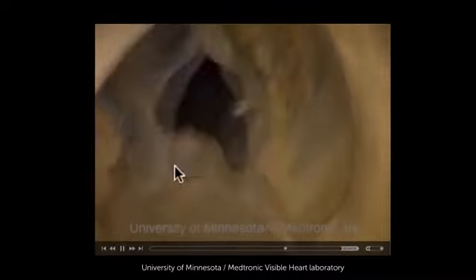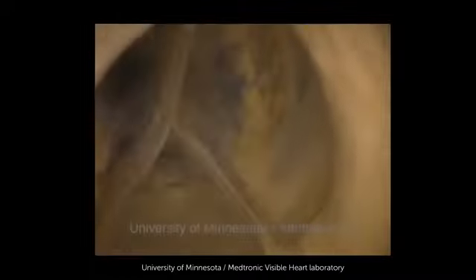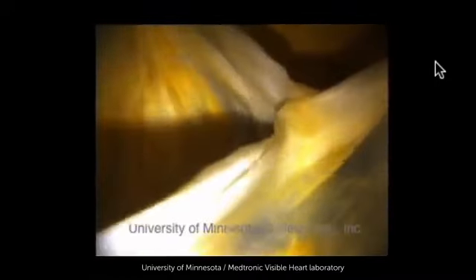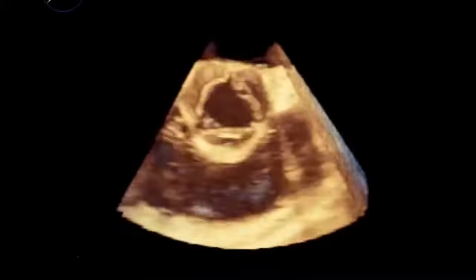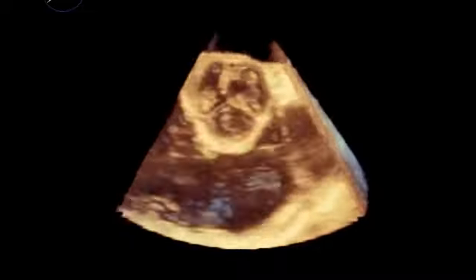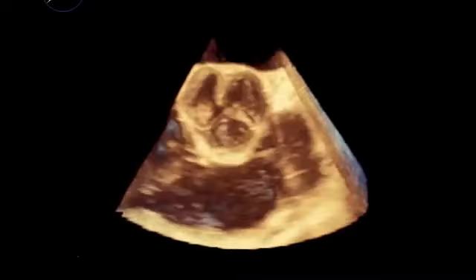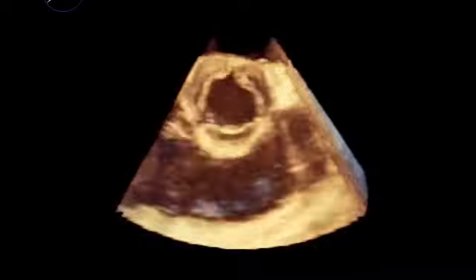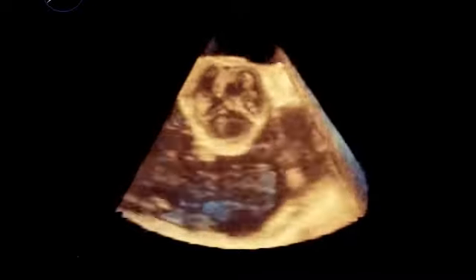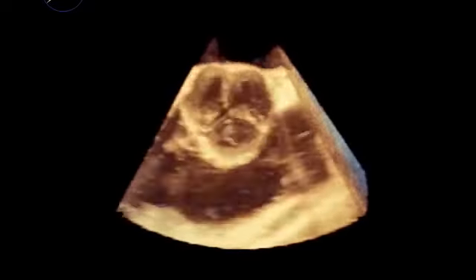Note how thin the valve actually is and how coaptation between the cusps occurs during diastole. In a close-up view, you can even appreciate the little nodules which are located on the tips of the cusp. At the beginning of this lecture, I showed you that these details can also be visualized with echo. What you see here is a 3D reconstruction, a technique which is now more and more used also in the assessment of valvular heart disease. This, however, will not be the topic of this course, maybe sometime in the future.